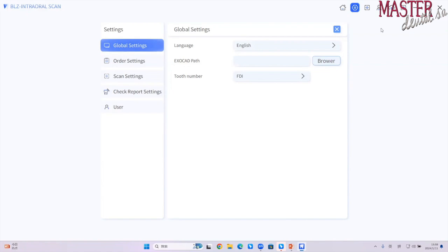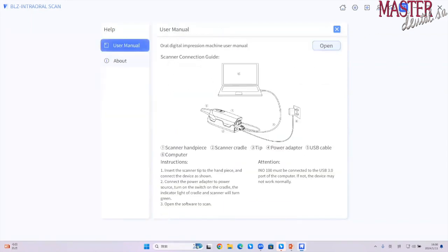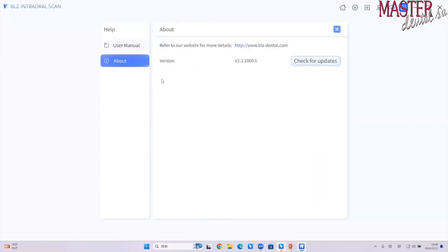I think most of you are curious about how to do the automatic upgrade inside the software, so I will do the presentation for you here. Now, if we want to upgrade the software, we need to enter the help page. Okay, that's my mistake. We need to enter the help page, and in the about, you will find the version of the software you currently have.